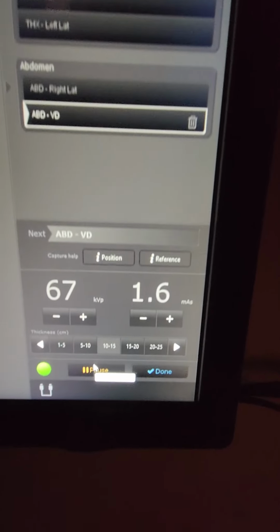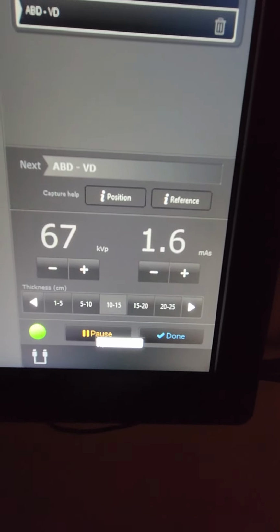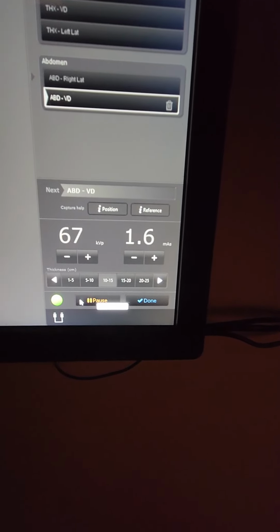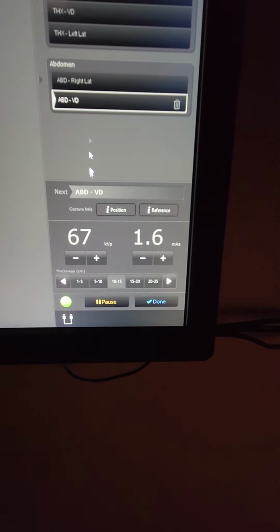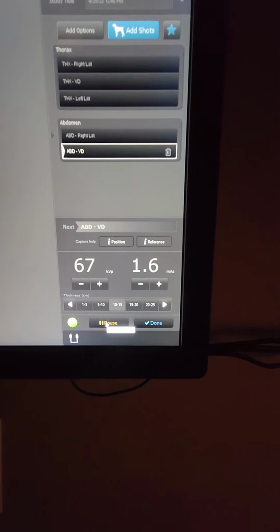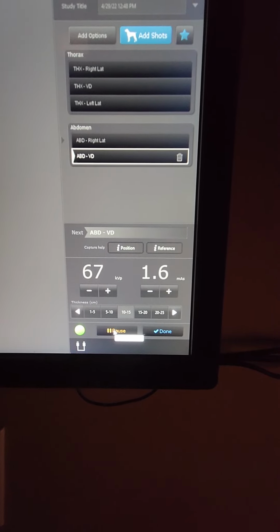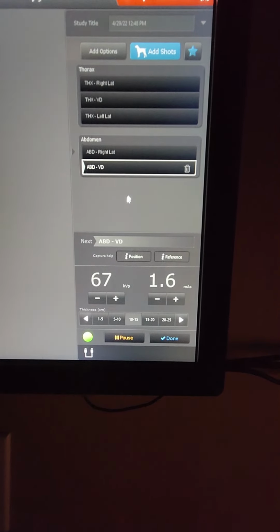Otherwise, you do have an option down here as a pause. So usually what I say is if you have a pre or post-op surgery, so if you have a pre-op and you want to do x-rays, you can, and then select all the options you want, and then pause it, and do the surgery and come back and unpause it, and you could actually do x-rays in between those on somebody else, and then you can unpause it and your selections will still be there.